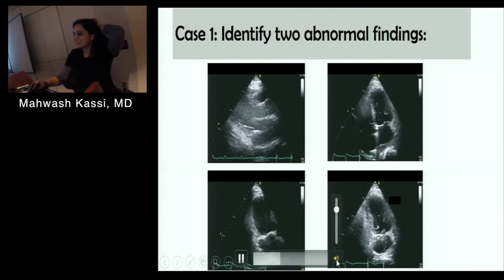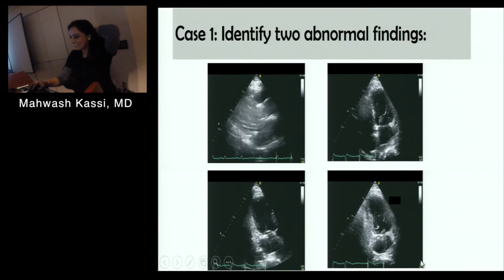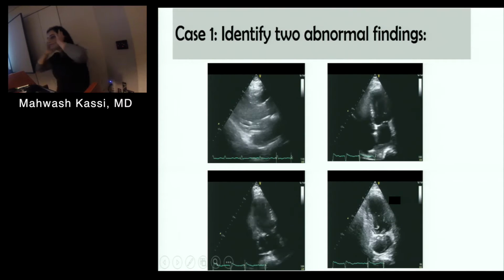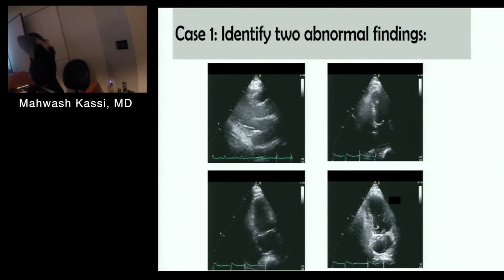Anything in the left atrium? Any takers on the left atrium? Now, move this bottom, yeah, this one right here. What do you guys see down there in the left atrium, down here?